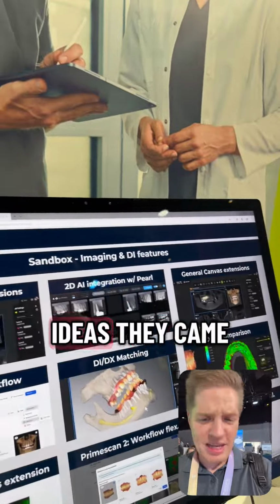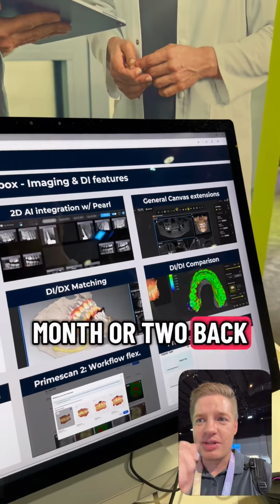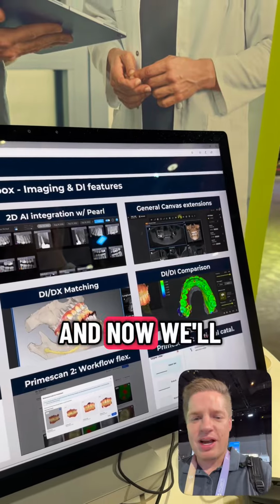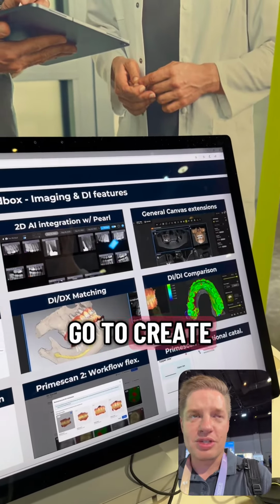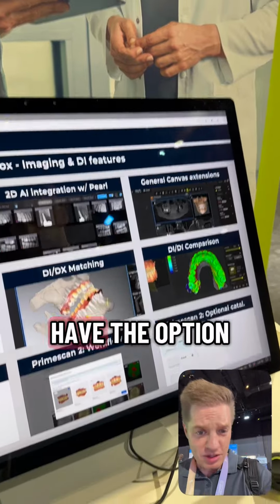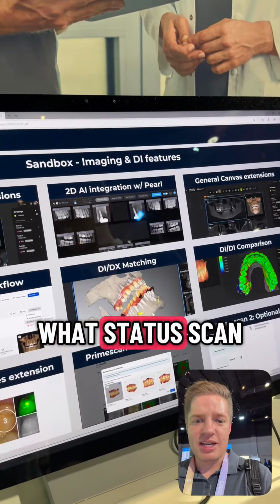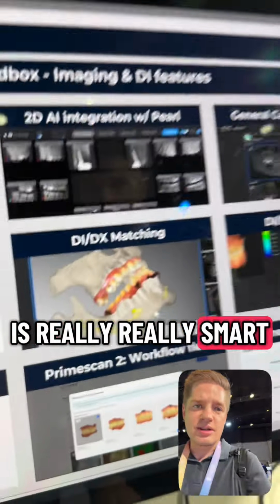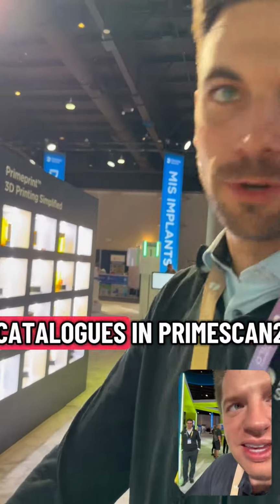So the idea is they came in on hygiene a few weeks back, maybe even a month or two back. We took their status scan, and now we'll have all of the scans at our disposal when we go to create the treatment, and you actually get to select which status scan to use. I think that is really, really smart, really awesome. They're listening. Great. And the last one is optional catalogs in PrimeScan 2.